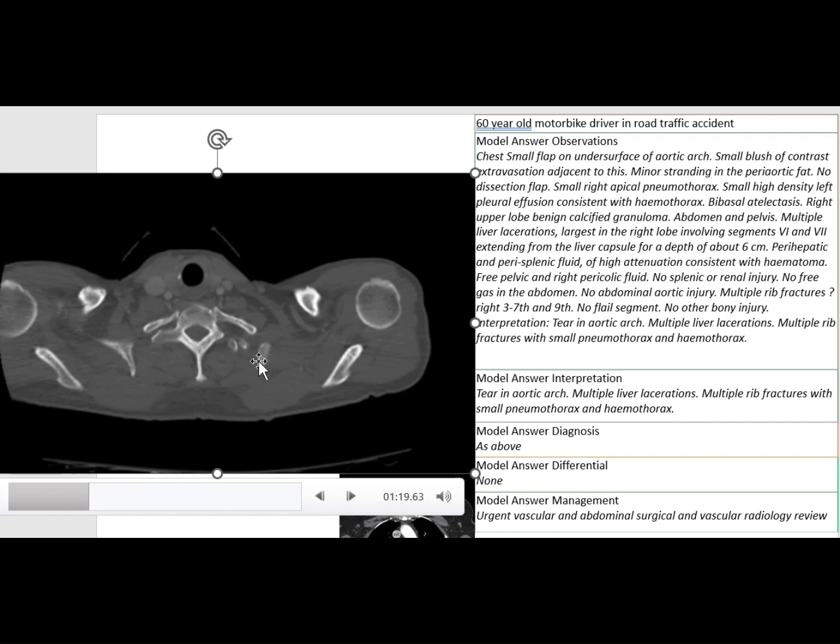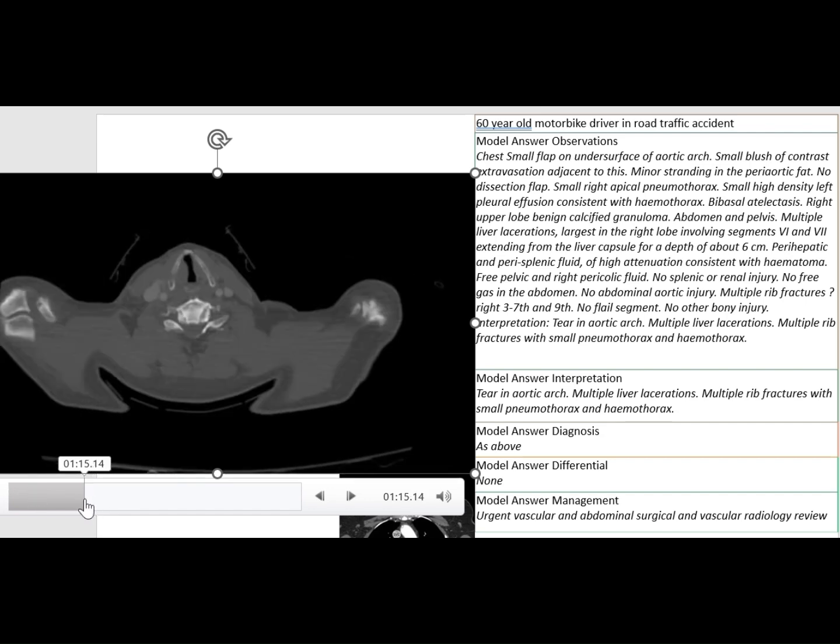So you need to look for rib fracture, as the rib fracture is the reason of the lung injury. So you need to inspect the ribs very carefully, okay? And I will show you how to look for rib fractures.